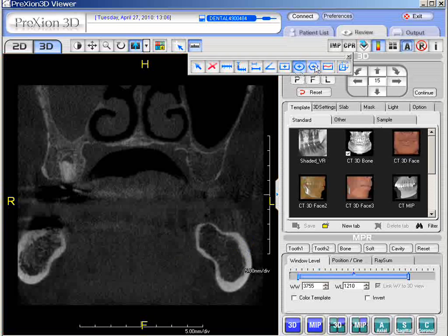This is the polygon. Polygon, I like it because you have the ability. It's like an Etch-a-Sketch. You can trace it out according to the borders that you wish to select. It's more freehand. That's why you can select the polygon. And now, again, back to the cancellous bone, you can see it has pretty much a wide deviation versus the other structures. So anyway, that is the real feature of using these three measurements here, whether it's rectangle or ellipse or polygon.